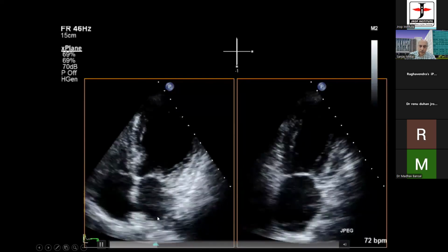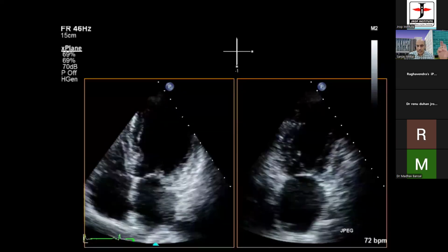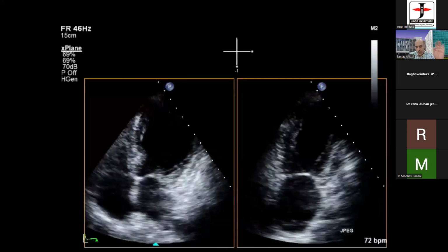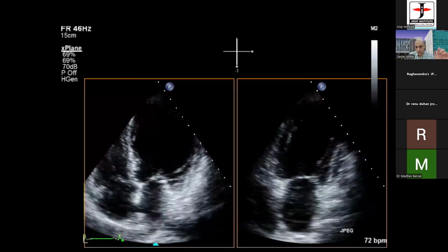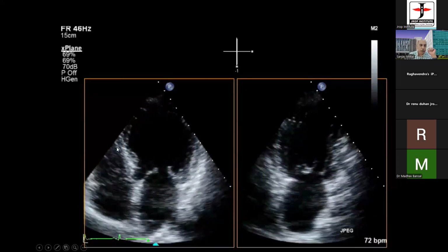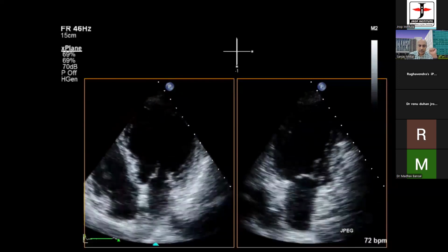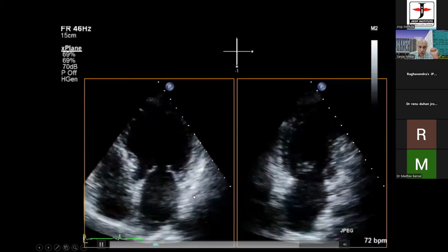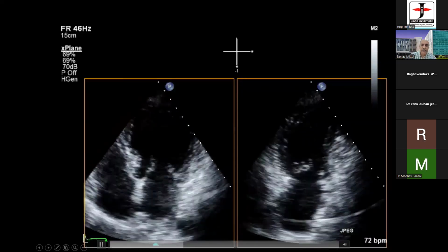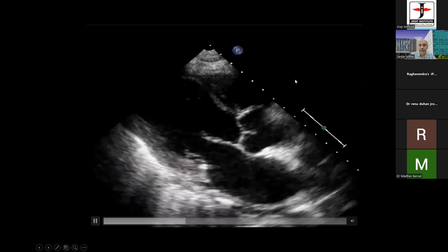So in this particular patient, what we can safely conclude is the LAD territory is not hypokinetic or akinetic, it's normal. RCA territory is normal. Circumflex territory is involved, and because lateral as well as posterior wall, both segments are involved, it is a proximal circumflex territory infarct. And this is all scarred and thinned out. It's unlikely to be viable. And this person is somebody who has had a sustained dense circumflex territory infarct.